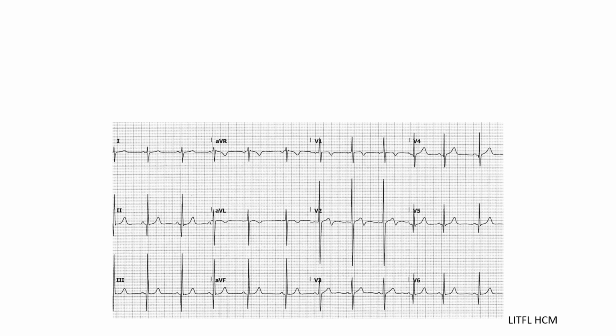So here we have an ECG, where you just go where the money is, right? You have someone who is syncopized and has very deep Q waves in the lateral and inferior leads, and also somewhat in the precordial leads.